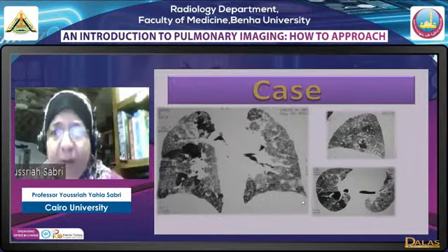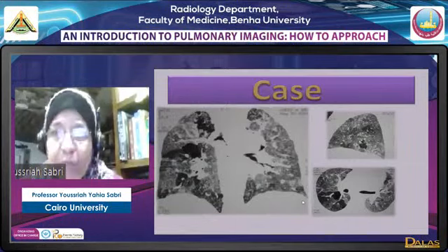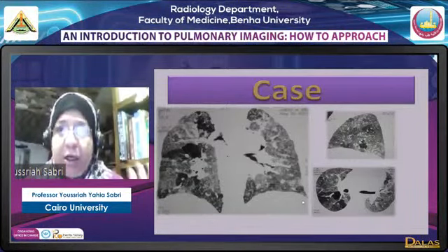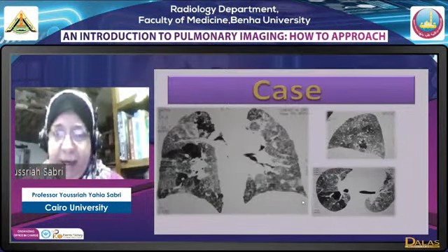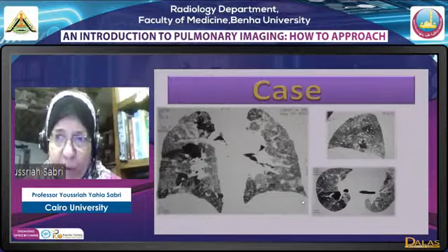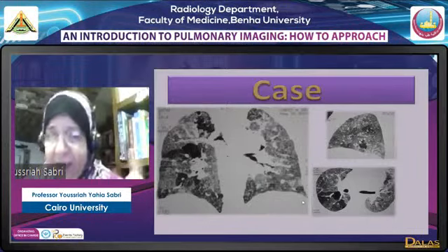This appearance is pathognomonic of subacute hypersensitivity pneumonitis. Subacute hypersensitivity pneumonitis may appear as bilateral, diffuse, centrilobular ground glass nodules. This is, if you see it early. Later on, what we see is actually a bilateral mosaic pattern with predominating ground glass opacification, intervening areas of lucencies that represent areas of hypoperfusion or aperfusion, and areas of normal lung with relative basal sparing.